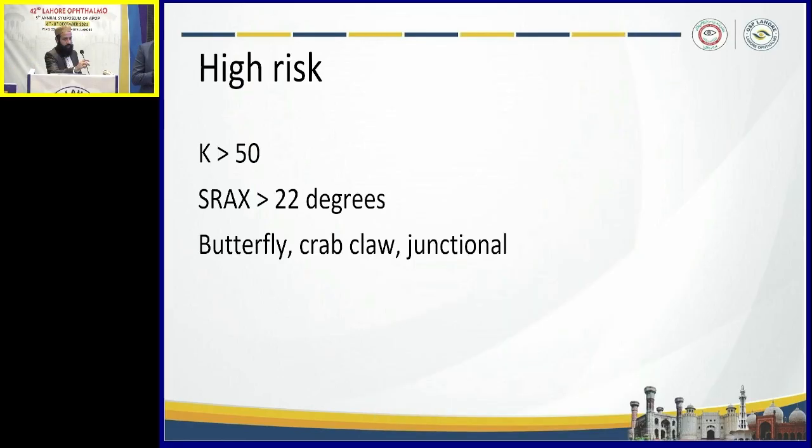I would like to add on all of this that I don't go through this in my presentations because I really don't feel that it's that important. This is sort of a leftover from the topography era where we only had the anterior surface, and this was put in high risk, medium risk, moderate risk. Anytime you see this, yes, it is a risk for keratoconus, but anytime you see this, you want to go back and again check segmentation, you want to check alignment, see the angle kappa. If those things are normal, then yes, you can think of the axial map as being abnormal.